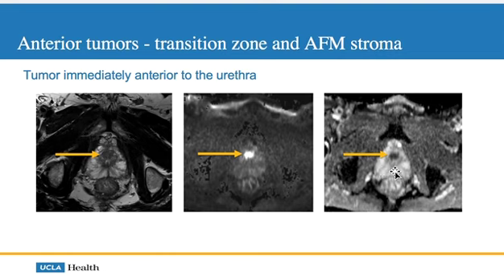So again, not really consistent with the prostate cancer in the peripheral zone. But what we do see, if you come back, is in the transition zone, just anterior to the urethra, actually, in that little strip in there is the urethra, you do see a hypointense area there. It has a little bit of that kind of smudgy appearance. This one is a little bit well demarcated, but certainly there's something there that's hypointense on your T2.